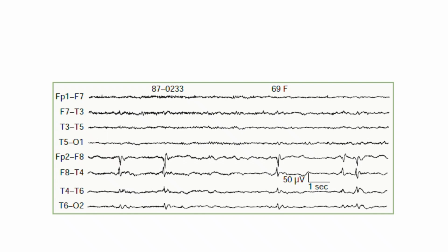The epileptogenic zone. The scarred, post-stroke tissue acts as an unstable focus where cortical neurons spontaneously and synchronously fire, generating the interictal spikes captured here.